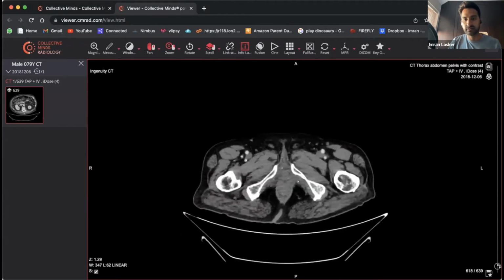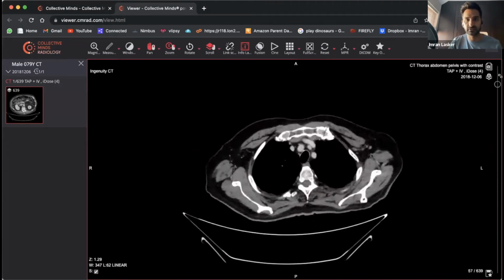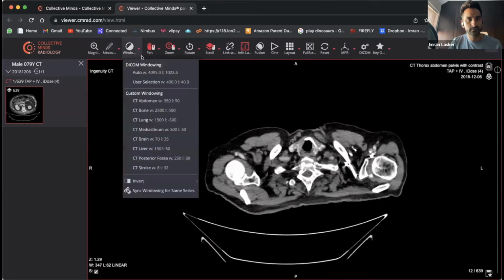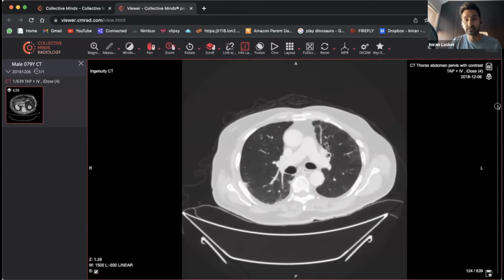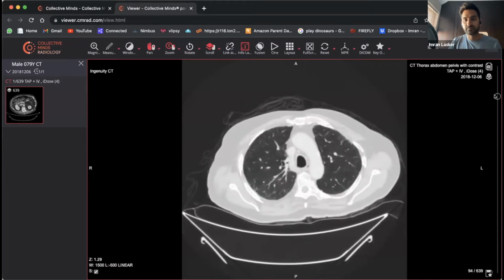And if nothing popped out at you, then that's fine. Now you've got to do the legwork and see what's going on. So we do have the chest images on this one, and I'm going to change the window to the lung windows. They've got abdominal pain. So one of the things may be, have they got air under the hemidiaphragms, or do they have pneumomediastinum or something like that. But as you scroll through, there's nothing like that.